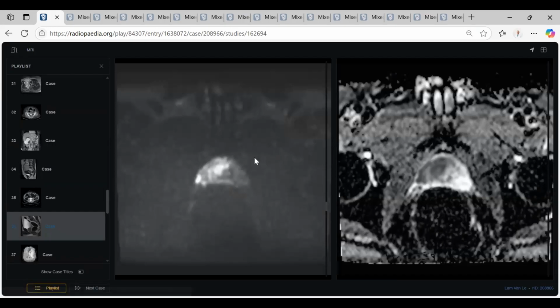Low and high. If you notice here, there is a bulging. There is some capsular breach or infiltration. This is at least grade 5. It is not requested in the exam to tell which, but at least this is cancer prostate. Thank you, doctor, so much.